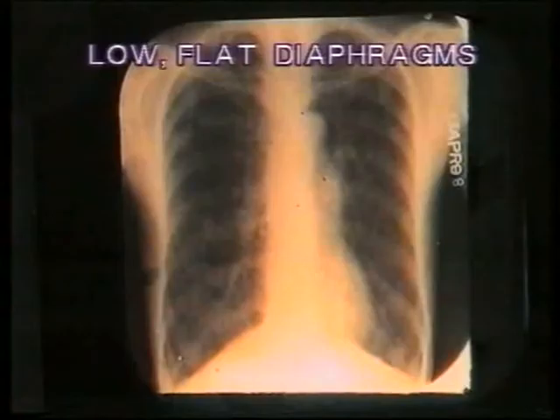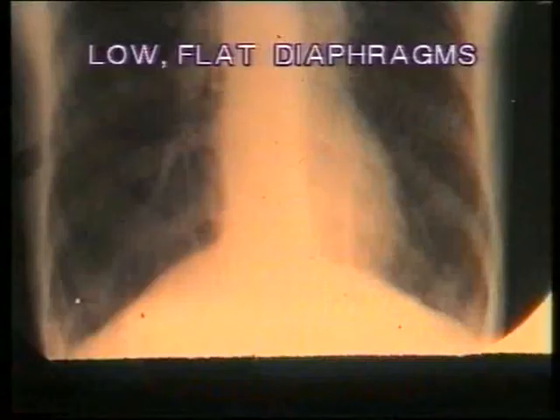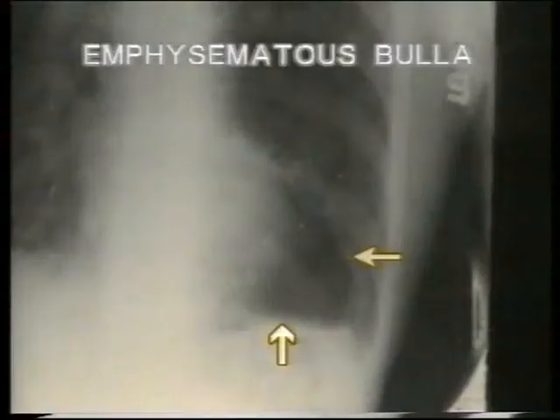Now in this X-ray, note the mediastinum and heart in particular. The heart is thin and vertical, termed as teardrop heart. Also, note the hypertranslucent lung fields, wide intercostal spaces, and low flat diaphragms. This is another X-ray of emphysematous lungs, shown for the low flat diaphragms. Note that the curvature of the diaphragms is reduced and they are almost straight. If right heart failure, that is cor pulmonale, has set in, then the right ventricle will be enlarged.